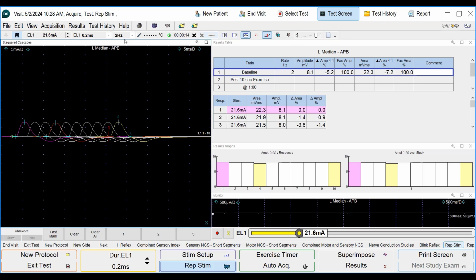As I indicated earlier in the protocol for Lambert-Eaton syndrome or presynaptic abnormality, sometimes your decrement continues beyond the 4th stimulation. So I want to see that. And in presynaptic abnormalities, you get more of a recovery. So that's a physiologic reason why I like to have a train of 10.